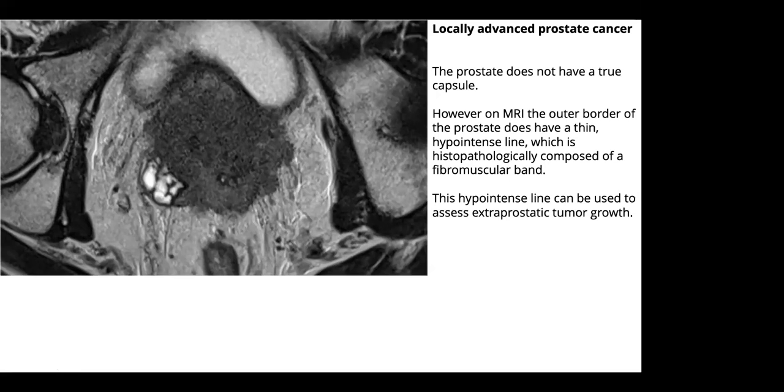As you have already shown, the white structure on the top of the image is the bladder, the part of the bladder that we can see. But posterior to the bladder, this whole area is hypointense. And if we follow the margins, especially on the left side, you see the lobulations. This is infiltration into the paraprostatic fat.